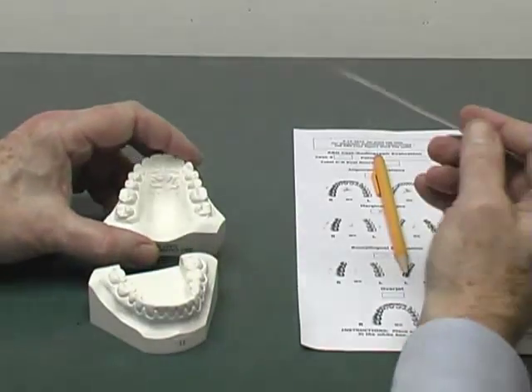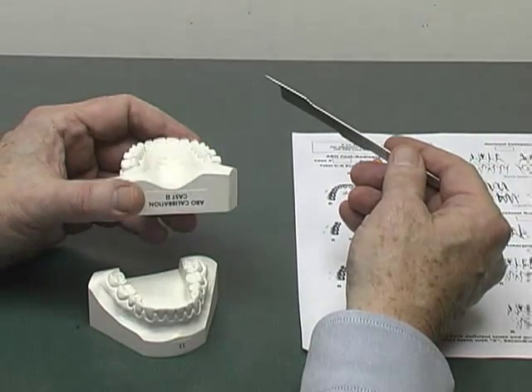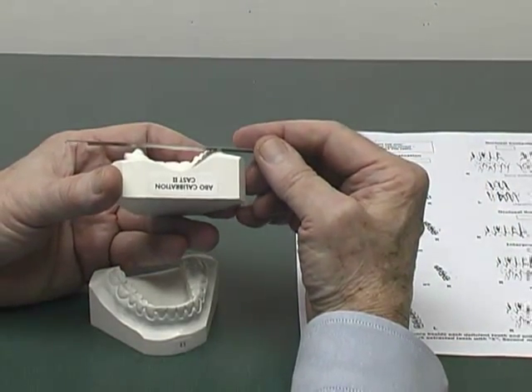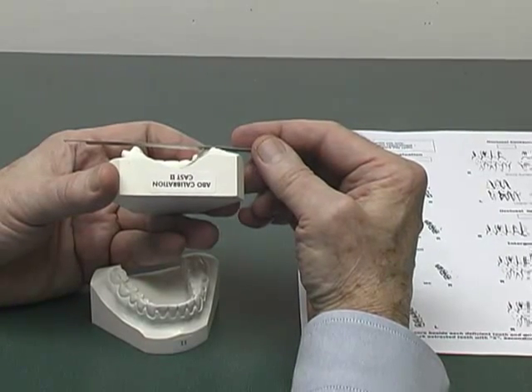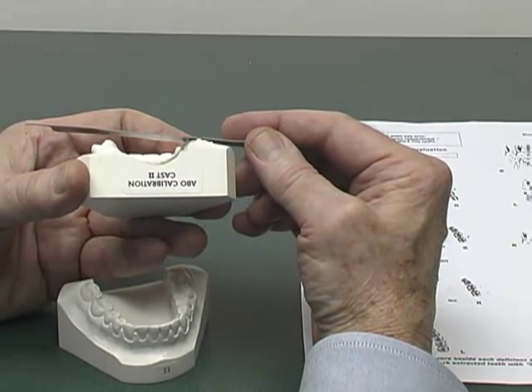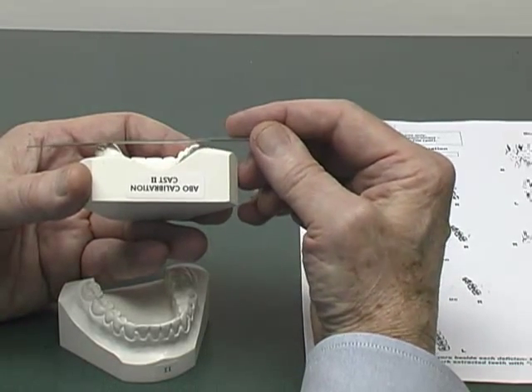To measure the buccolingual inclination on the maxillary cast, view the cast from the posterior, looking down the occlusal plane. One aid is to quickly visualize the teeth that may be tipped using the flat surface of the measurement gauge, as so.